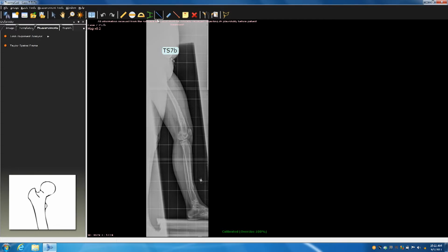But so if you take your line, let's just guesstimate the head's probably right here, and just for giggles, you do your axis, and you can see that you have a flexion deformity. You're behind. You can kind of see that already, but if you wanted to be quantitative, from the hinge point over, you can measure your MAD. The other thing is you want to measure your anterior cortical lines, because that's really important, as we talked about, how to analyze what's coming from the bone, what's coming from the soft tissues, no surprises.